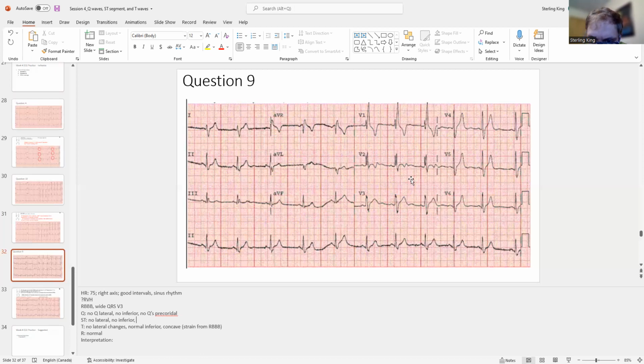Maybe a little bit up, not by much if it is. V2 and V3 need a little bit more, so let's be generous there. This one could be up a little bit, but again, it needs to be more. Maybe a bit. Pretty even.